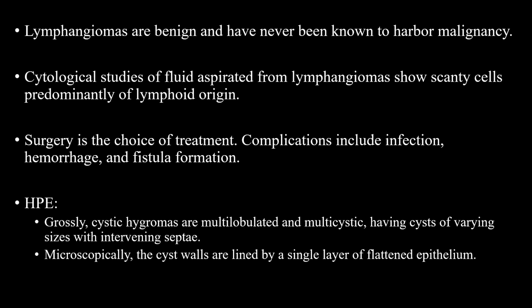So this was the interesting case of diffuse left breast lymphatic malformation that we had seen in our ultrasound posting.